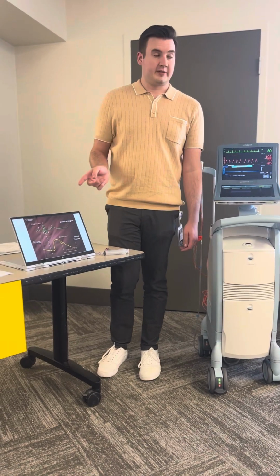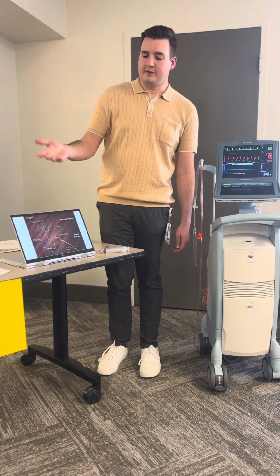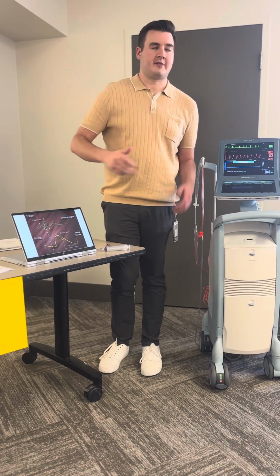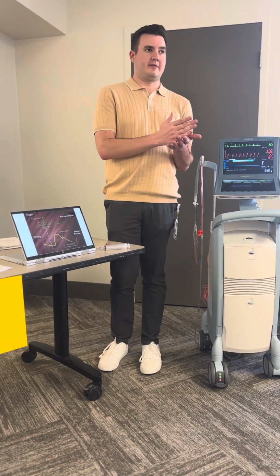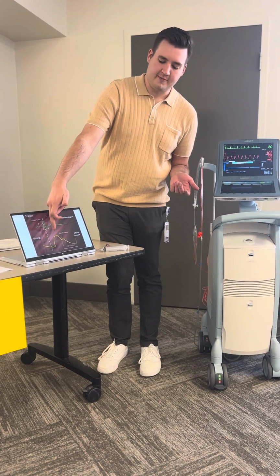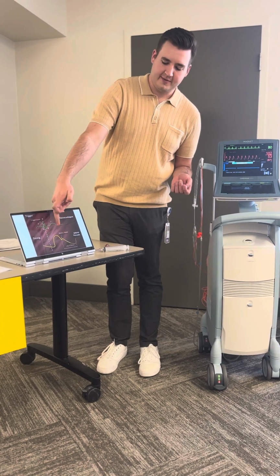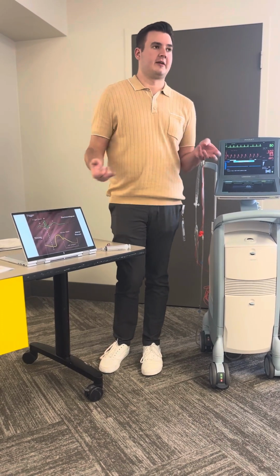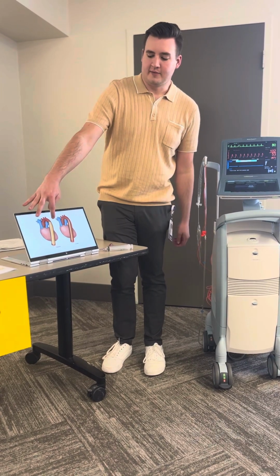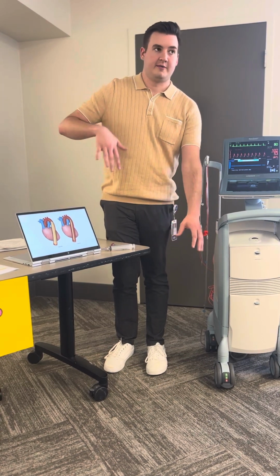So there's a trigger event. The balloon just doesn't go like this 24/7. It gets triggered by something, and we always use the ECG. So it gets triggered by the R wave, and that's what signifies, okay, I'm gonna need to pump here in a little bit, the balloon does. And so it looks at our arterial line waveform as well. And at this dicrotic notch on our arterial line waveform, that's when the balloon starts to inflate because the aortic valve is closed. And so it inflates, and then blood fills up here, and then it deflates, and blood gets pushed out.